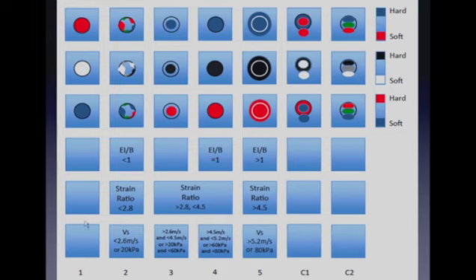But if we look at all the data, everyone that has a strain ratio of less than 2.8 has shown that these are benign lesions, so we're going to give that a 2. And for everyone that has done this, if the ratio is greater than 4.5, we give that a 5, because those cases have all shown malignancy. And again, there was a wide range between 2.8 and 4.5, and I kind of cheated and gave that a 3-4.